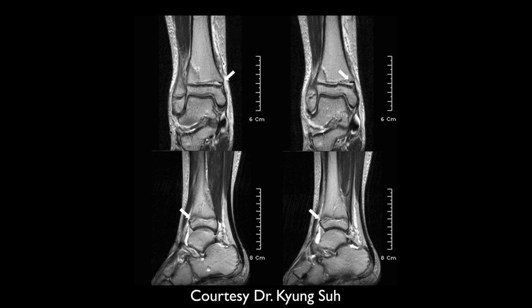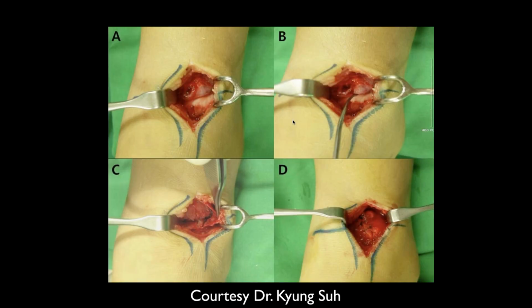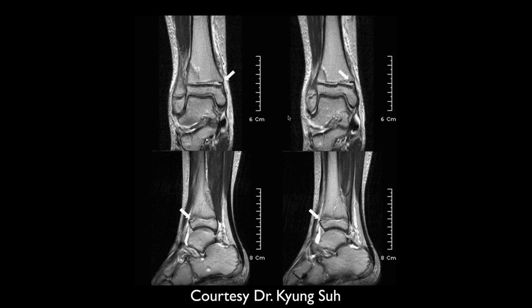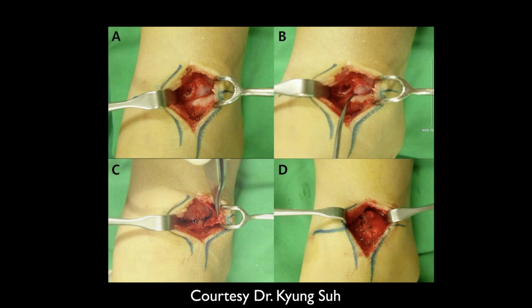Okay. And then we have some coronal and sagittal MRI images. That fracture fragment is really not significantly displaced, but medially there, it looks like there is a linear low signal intensity periosteal fragment displaced in the physis. And some widening, isn't there? Right here. Yes, there is some widening of the physis there, with maybe perhaps some fluid. And there's a posterior distal tibia fracture, I think.